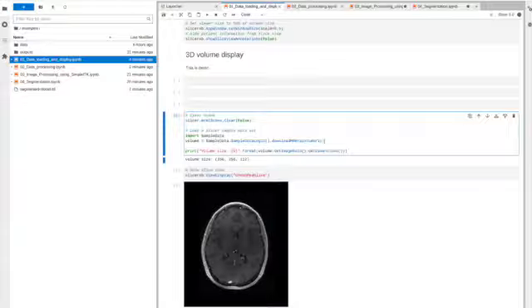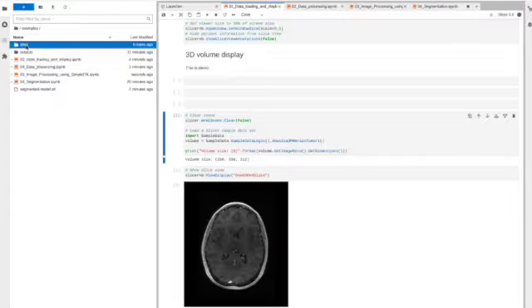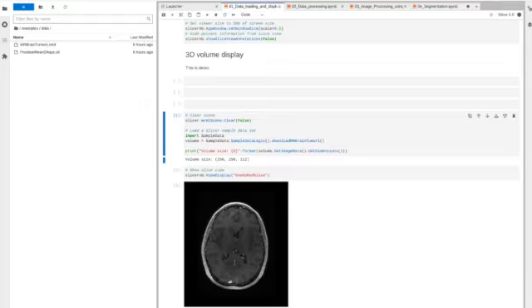Oh, so it's just loading sample data here. So we'd essentially change this and point it to your actual data set, which could actually be in your CGC project. So it wouldn't have to be here in the data folder. You could, which I actually would advise against, especially if you have thousands of DICOM images. I would keep those in your CGC project and just point this code cell back to your CGC project.